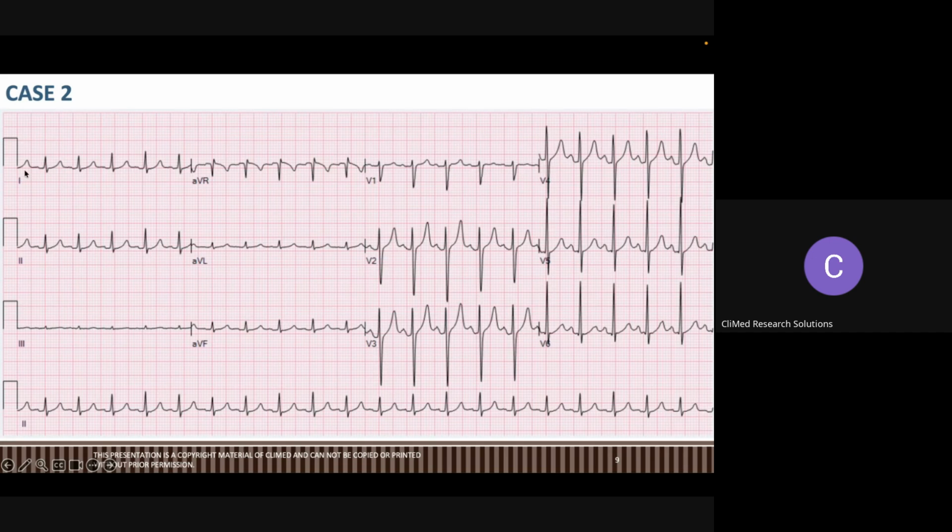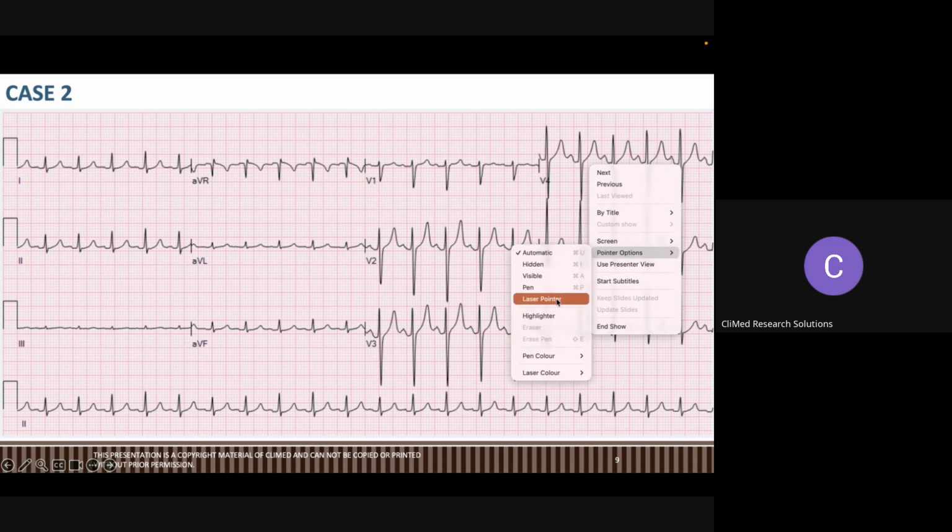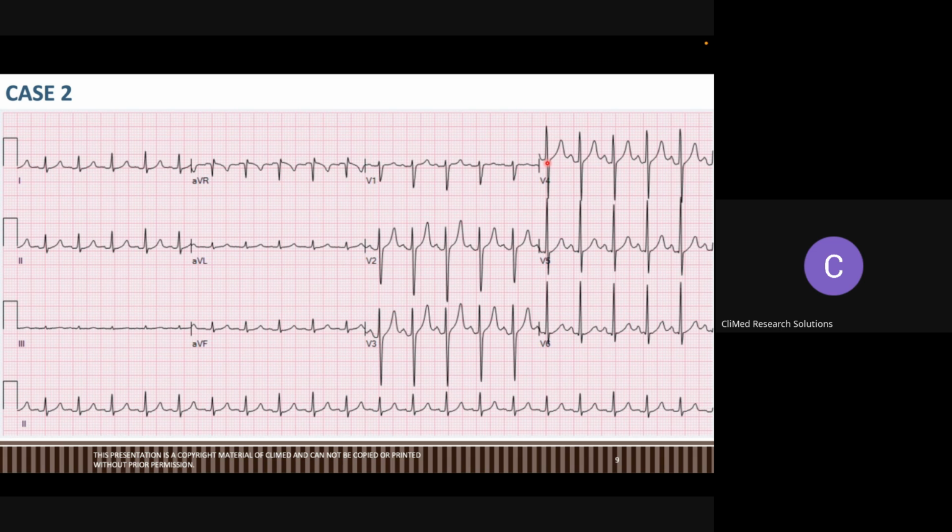See, if you think it is not straight, look at this. From here, look at this, completely straight. From here also, look at this base, from where the ST is generating upside. See, at the same line point. How can you say that there is PVC? The line is generating here, here, here, here. There is no Q. See, all QRS complexes and each wave is similar.